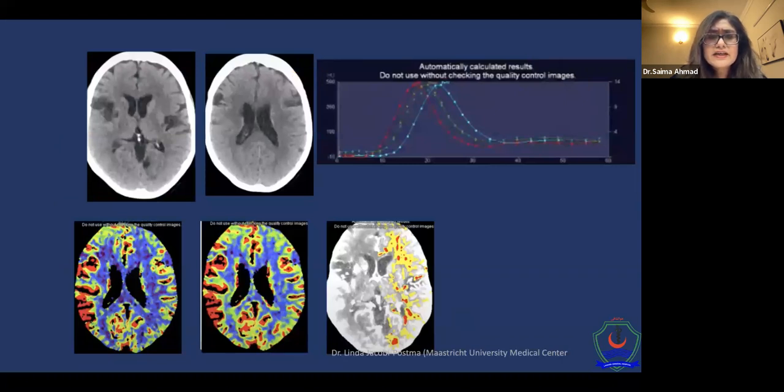This is again a case in which the patient had a stroke and went back home with a normal CTA. You can see the stroke is on the right side when the patient came back and had the CTP. There was some kind of seizure going on, so it was picked up like this. These kinds of problems you may encounter in your daily life with CTP interpretation, and you must be aware of all these.